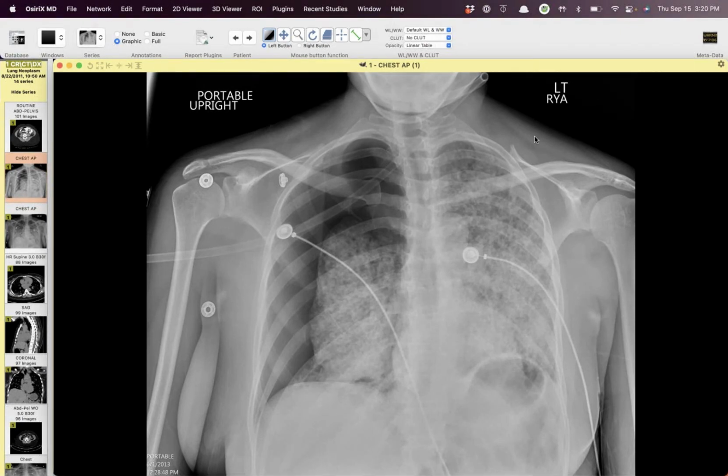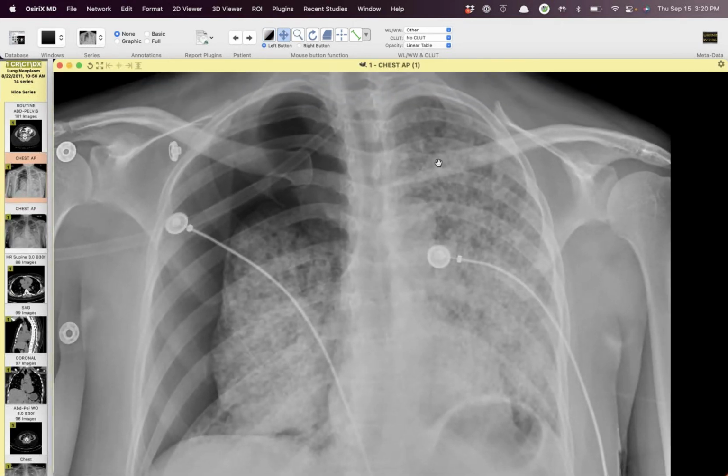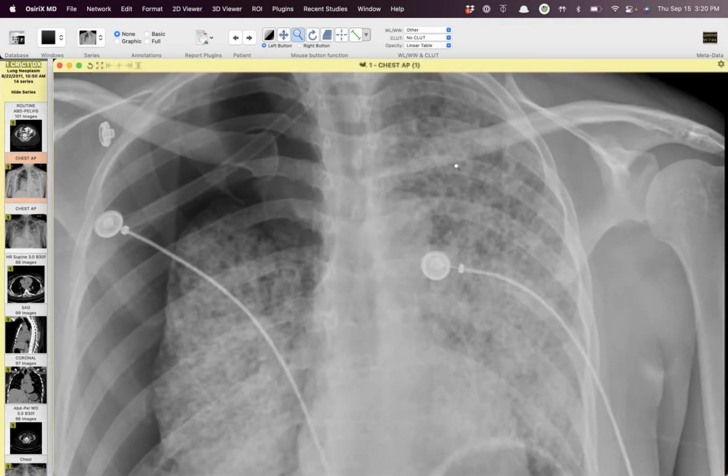So I've got a few cases here. A couple of these are older ones that Paige was going through, some of his old stuff, and showing me, and figured I'd share. So this lady is, I think, in her 30s, maybe younger than that, 43 at this time. And you can see she presented with a spontaneous pneumothorax, and when you look, her lungs are diffusely abnormal, way too white, and maybe you can tease out there's some nodules there.